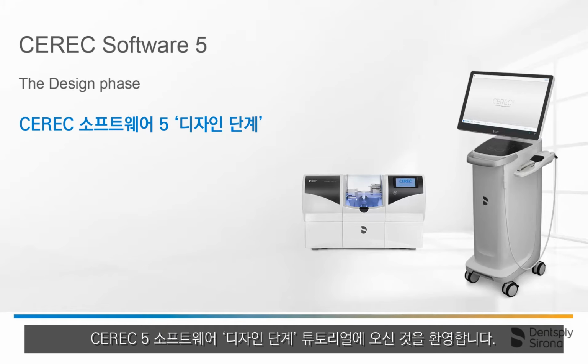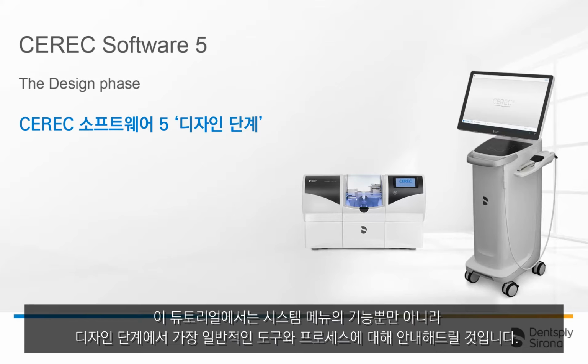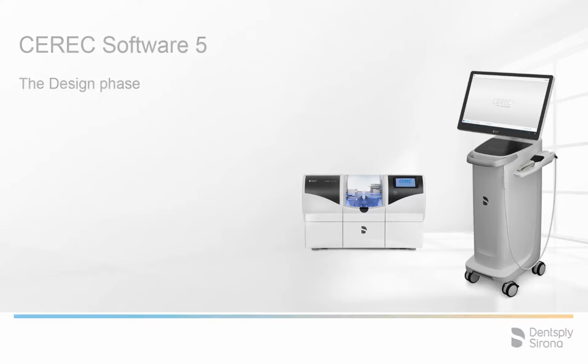Welcome to this video tutorial on the topic of the design phase. In this video, we will guide you through the most common tools and processes in the design phase, as well as the functions of the system menu.